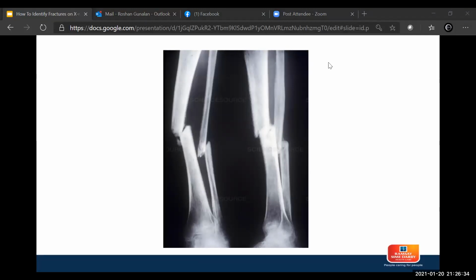Okay, Ethan said it is the leg, thank you. Ethan said, let me see. So mid-shaft tibia and fibula fracture, displaced. Serena said mid-shaft, comminuted and angulated. Correct. Ethan said whether it's the hand or the leg, but it's actually the leg. Oh my God, Ethan, I'm so disappointed. No, that's okay.